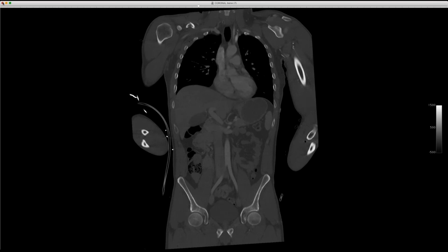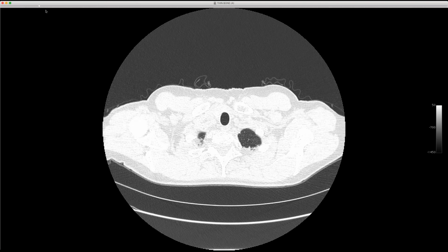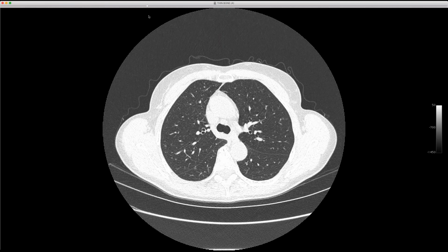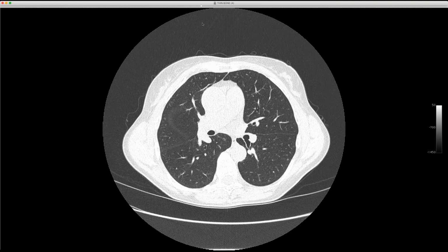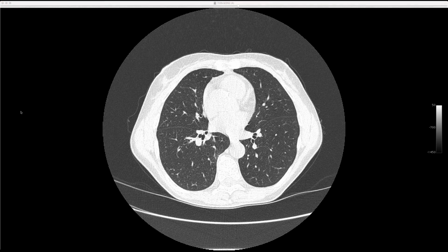Okay, this case, which I will show the images as soon as it lets me. This was referred to us to evaluate lung nodules on abdominal CT, patient asymptomatic. It's a middle-aged woman who had some vague abdominal pain, nothing exciting. When I saw this, I kind of knew what it was, and we're not going to biopsy it, but you can see she's got these very small, very poorly defined nodules. Some of them almost look like little Cheerios. They have little holes in them. Jeff, if you can zoom in.